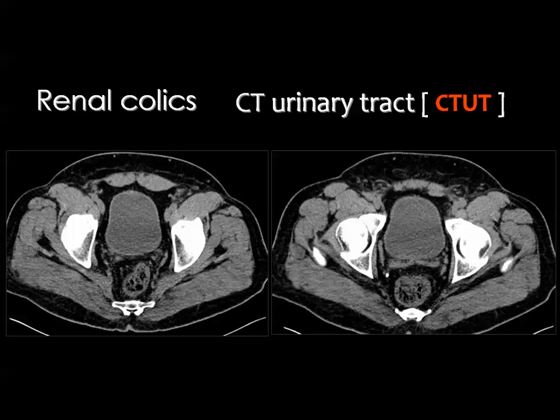And now you know that CT-UT is one of the commonly used techniques for diagnosis of small undetectable urinary tract calculi, I mean by ultrasound and by the IVU. And by this technique, you obtain multiple sections from the level of the kidney down to the end of the urinary bladder, and these sections are taken at 3 millimeter intervals, and you look carefully for any radiopaque shadow along the urinary tract.